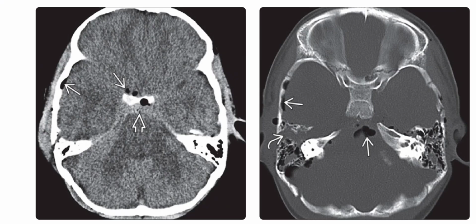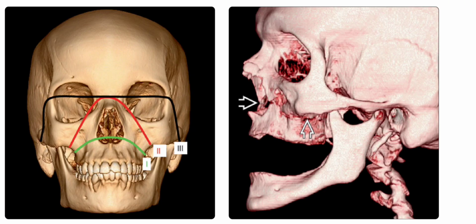Left is the non-enhanced CT scan in a 3-year-old boy with severe head trauma, and it shows the brain swelling with obliteration of all the sulci and subarachnoid cisterns, the intracranial air, that is pneumocephalus, and subarachnoid hemorrhage. Right is the bone CT scan in the same patient, and it shows the importance of determining why the intracranial air is present. Multiple skull fractures are noted here, including a longitudinal fracture through the aerated right temporal bone. So these are the introductory images to the CNS imaging of trauma cases.